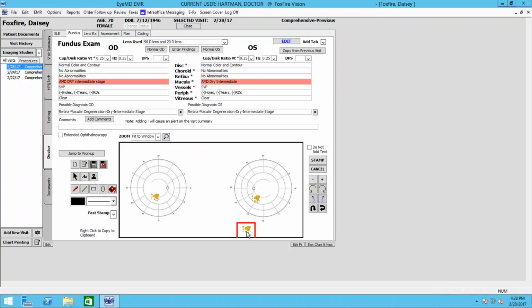Now, right click. Okay, now you want to hold it down and drag it to there. Remember, it'll go to the last stamp that you did. So you'd want to bring it closest to the last stamp. Oh, so you have to bring it over here. Yep. It's not moving. There. And then right click to make that line.